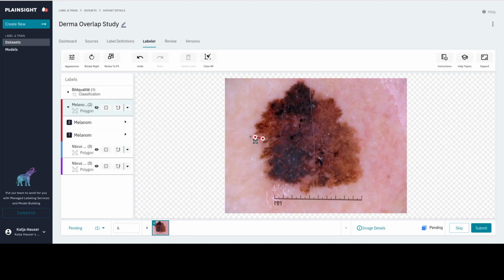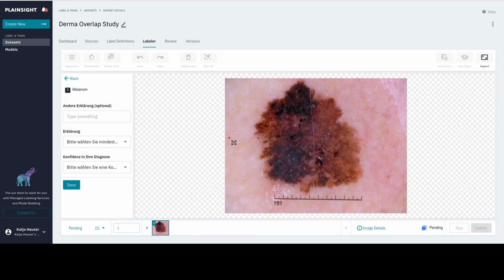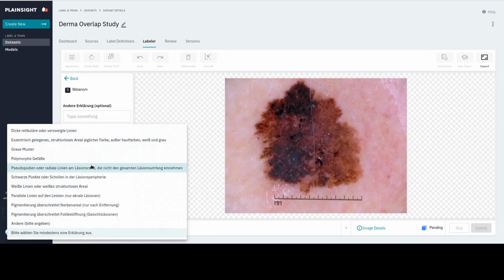You can then, if melanoma is still selected, annotate the radial lines at the edge as before. Since this is only about the lines at the edge, I actually annotate the edge from inside again with some distance. If I end the annotation process right now, this new annotation will also disappear because I had hidden the annotations earlier. But don't worry, this is normal.